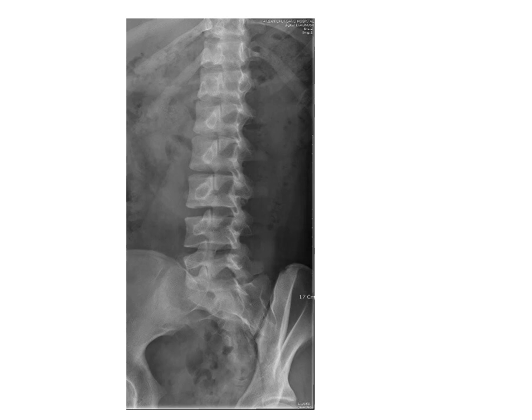So we're going to just assume and look at this image as if it was done as an AP projection, meaning that the beam entered the front of the body and exited the back of the body. This means that the patient was placed on their back, or standing upright at the upright Bucky with their back against the Bucky, their back against the table, closer to the IR, so that the beam is entering their anterior side.